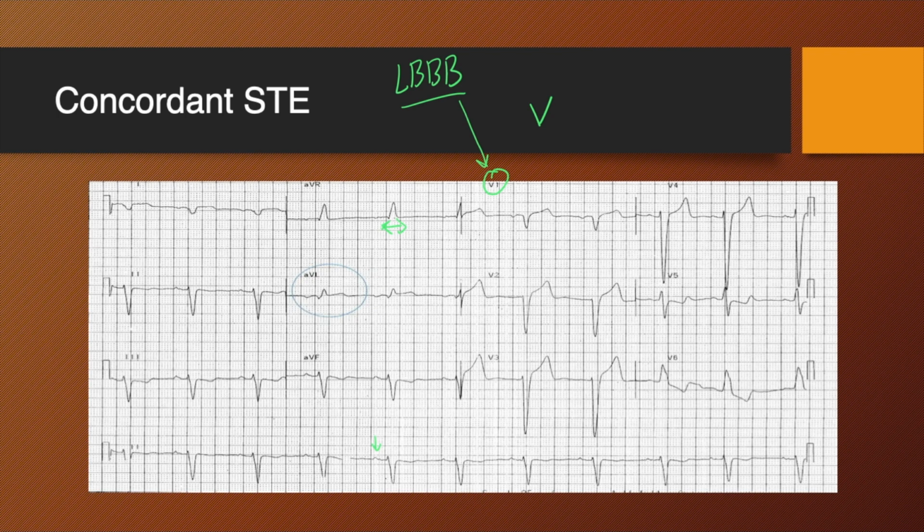If you want to turn to the left, turn your car to the left, you will pull your turn signal down. And if the QRS deflects upright, right, and you want to turn right, you would flick your turn signal up. And so that would indicate a right bundle branch block, and downward would indicate a left bundle branch block. And so you can see these wide downward deflected QRSs in V1, and that is diagnostic for a left bundle branch block.